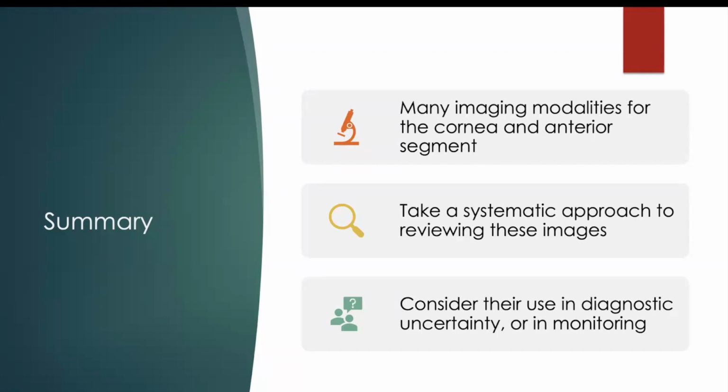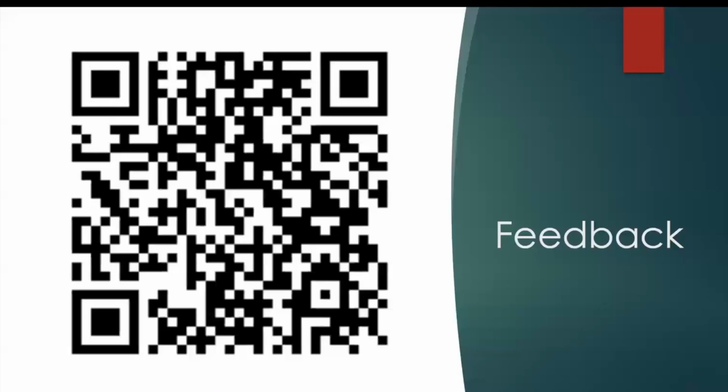I hope I've given you a way of approaching these different investigations, especially the Pentacam, which can sometimes seem overwhelming in terms of the amount of information you can get from it. But if you go through things systematically, especially with those 4 refractive maps, then you can start to understand what it is that you're looking at with the cornea. So that brings us to the end. It's a quick tour of corneal imaging.